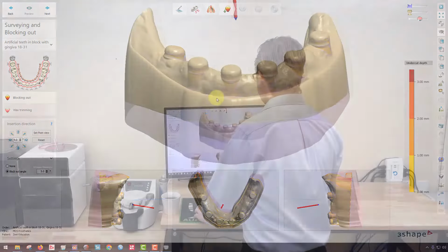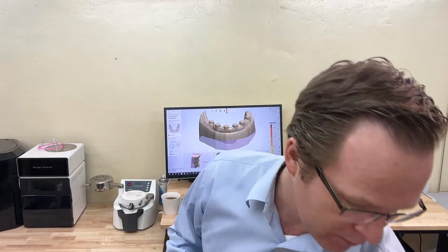And as I mentioned before, it's very important to understand here too, what is the purpose of the scan body? The scan body creates a 0.5 millimeter space all the way around the locator fixed housing. So if you wax up the exact geometry of the locator scan body, it will give you the perfect sized hole for you to go ahead and do a pickup of your prosthesis.